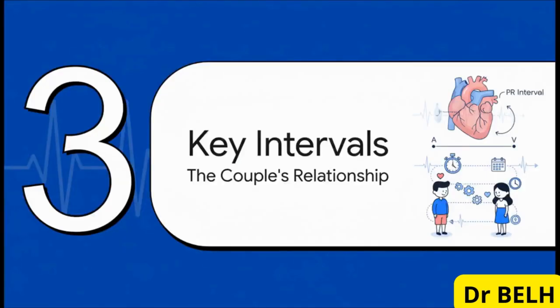Okay, now we move on to the intervals, and we're going to focus on the PR interval. This little space tells us how long it takes for the electrical signal to travel from the atria down to the ventricles. But instead of trying to memorize a bunch of numbers, let's turn it into a story. The story of a couple's relationship and how punctual they are.